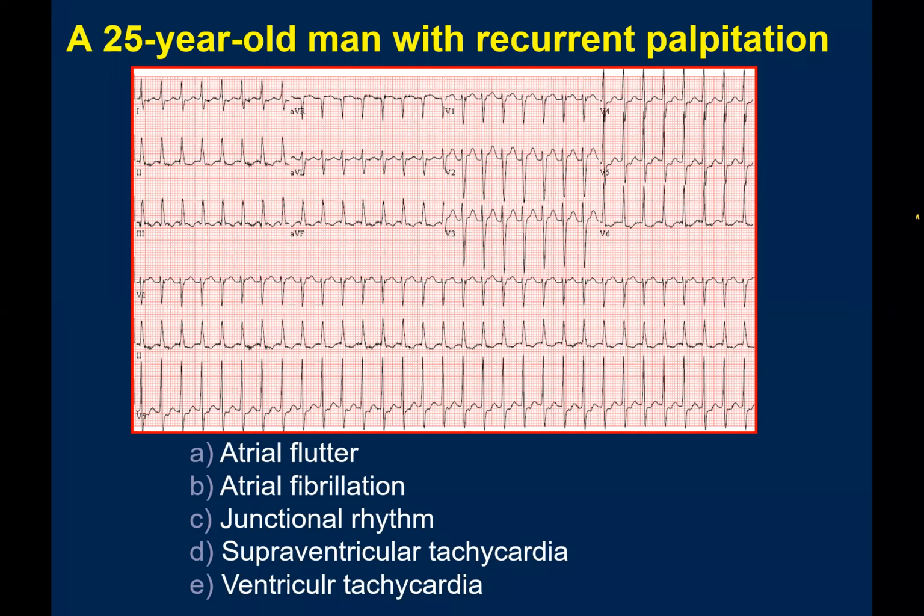Re-entry tachycardia, which is AV nodal re-entry or AV re-entry with accessory pathway. So typically SVT has three differential diagnoses. Could be AV nodal re-entry, re-entry in the AV node, and this is the commonest in adult population. In pediatric, the pathways are more common. Second is AV re-entry, which is a pathway. The third could be atrial tachycardia with long conduction, so the P wave is hidden within the T wave, so you don't see it.